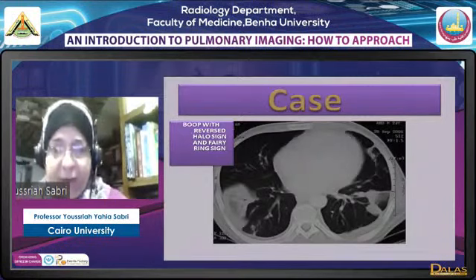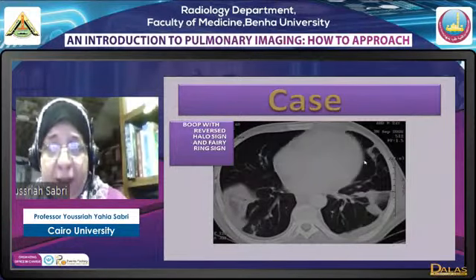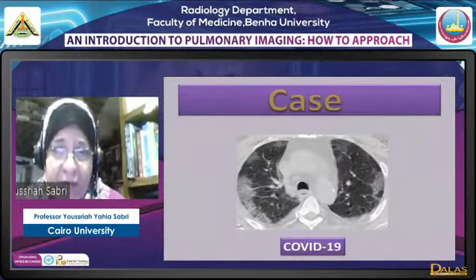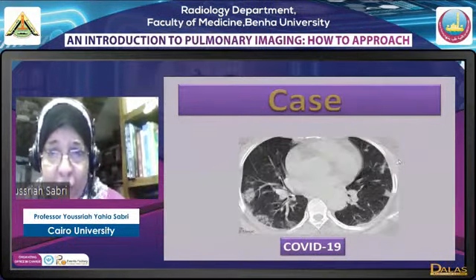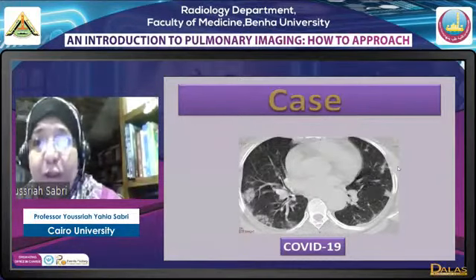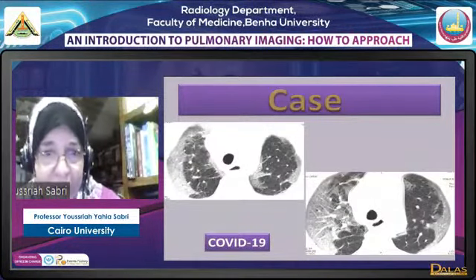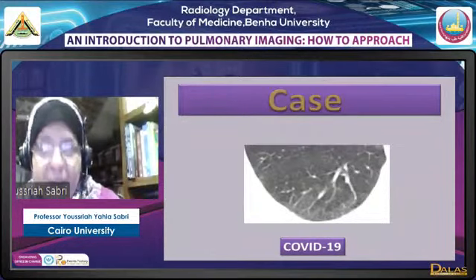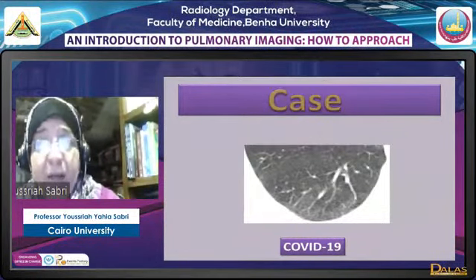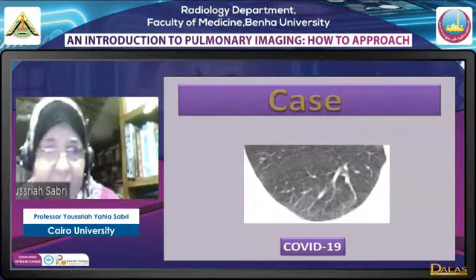Organizing pneumonia, as you can see, sometimes is associated with the reversed halo sign, which is very pathognomonic for organizing pneumonia. This pattern of bilaterality we see a lot today in COVID-19 because, as I told you before, COVID-19 may present by a pattern of atypical infection or a pattern of organizing pneumonia. So this pattern is due to organizing pneumonia. These all are cases of COVID-19. They could be bilateral, and we see a lot of unilateral cases, actually, mild unilateral cases, as in this case.